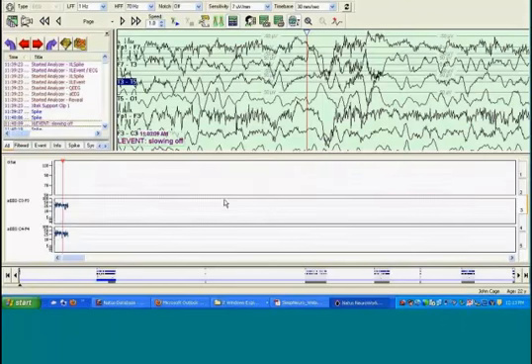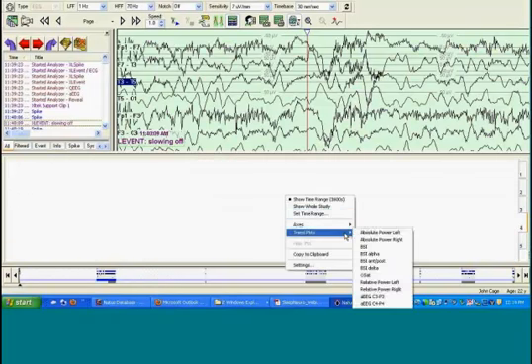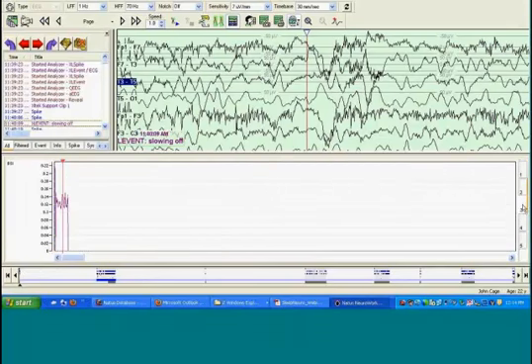And let's say on tab 3, I've already got this configured for a few other ones. Let's go to tab 4, right-click, go to Trend Plots again, and we can add, let's see, BSI, brain symmetry, just for delta.